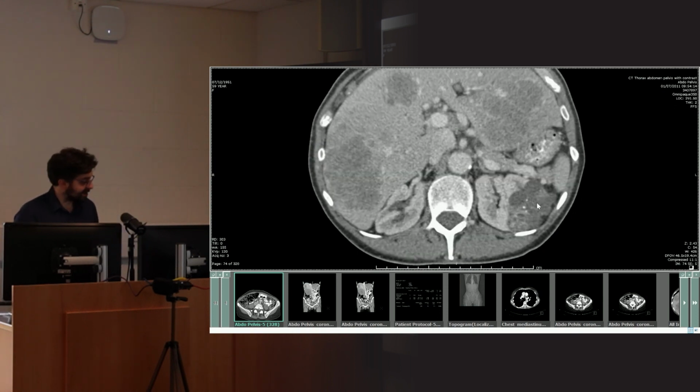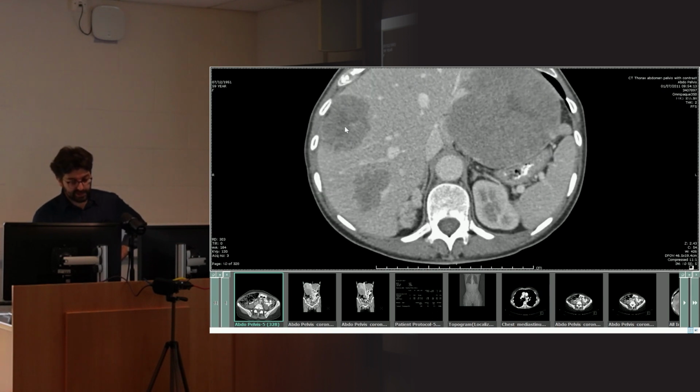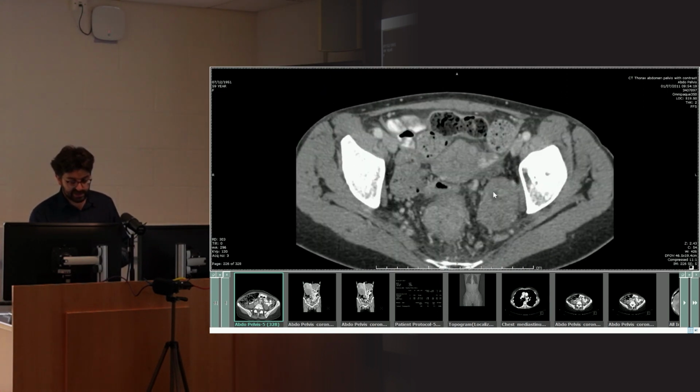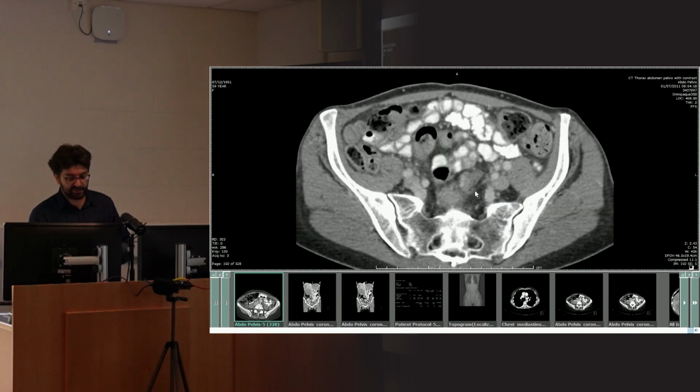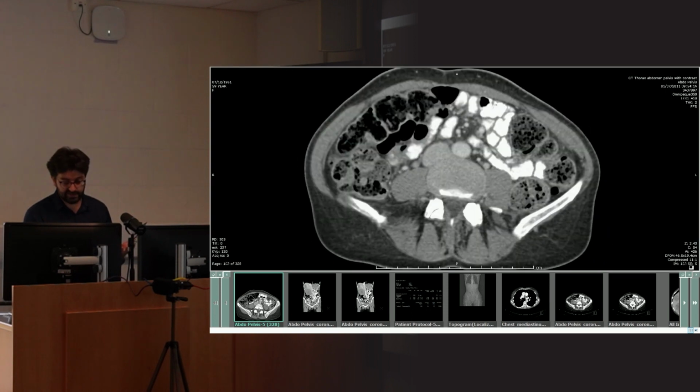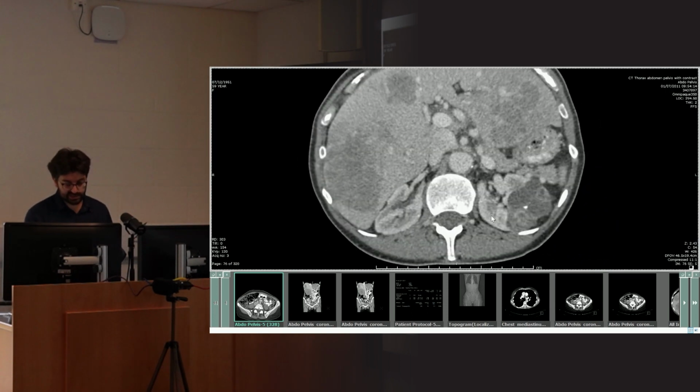So the next question is going to be, well, hold on a second. If they've got a renal tumor and a rectal tumor, how can we be sure that the metastases are from the colon and not the kidney? Well, firstly, the pattern of disease. Big liver mets, especially liver mets that look like this, big blotchy hypovascular liver mets, much more in keeping with colon cancer. Also, the colon tumor looks more aggressive because you've got loads of big nodes around it. You've got vascular invasion. You've got all features that tell you this is a very aggressive tumor, whereas the renal tumor doesn't look so aggressive.